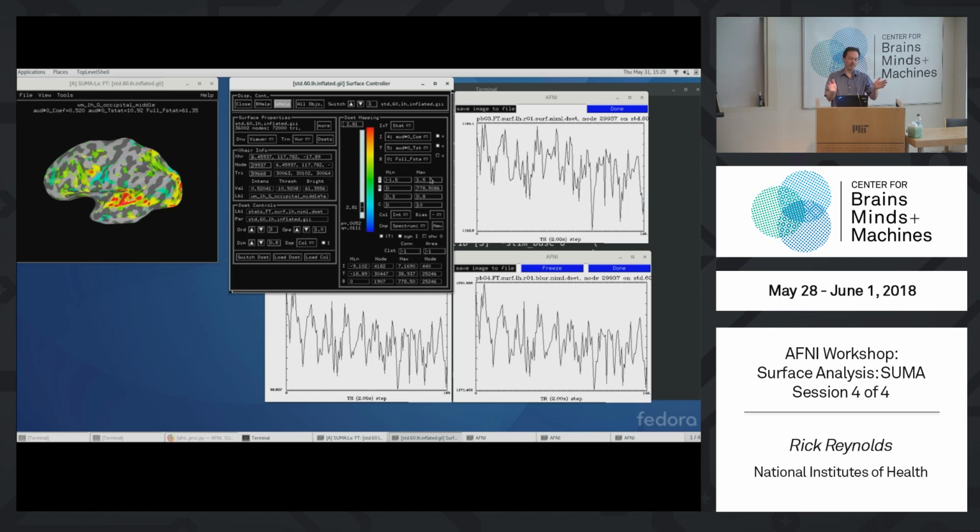So I'm going to type in a 1.5 here, and then it handles the min and max from negative to positive. It just automatically makes it symmetric. That's actually because this Sym I down here, symmetric intensity, is toggled on right now. And so lo and behold, there's the data on the surface.